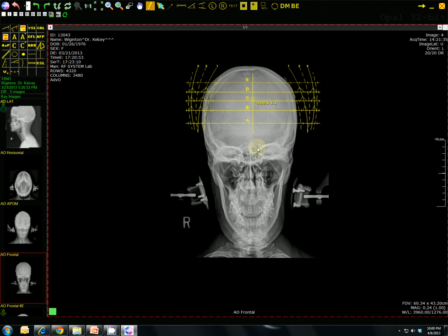And the other thing you can do is sometimes using the mouse is a little bit too hard, it moves around too much, and you just need to have minimal control. And that's where using the down arrow, the right arrow, left arrow, and the up arrow allows for the small movements. Okay, now I'm going to highlight this and delete it.